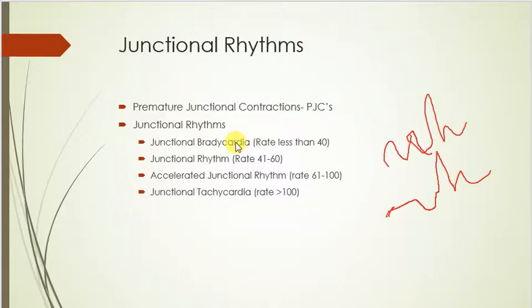Okay. So, junctional rhythms, typically we have just PJCs, which are not really a rhythm, but it's just what we call a funky little beat that happens that you need to be aware of. But we have a junctional Brady, a junctional rhythm, accelerated junctional, or a junctional tach. Okay. So if you tell me, oh, Miss Pizzotti, come on, I'm not memorizing all that, I agree.